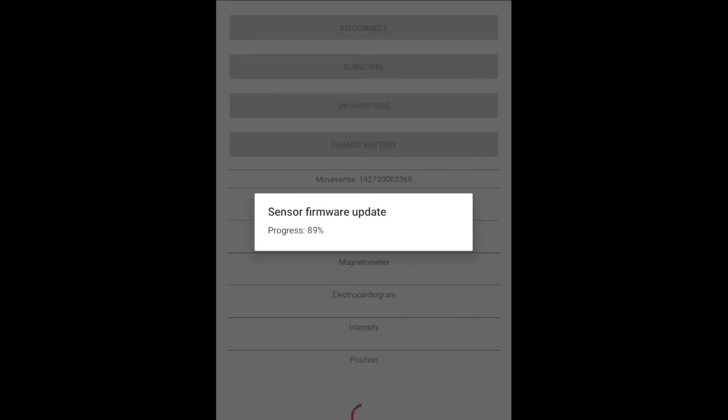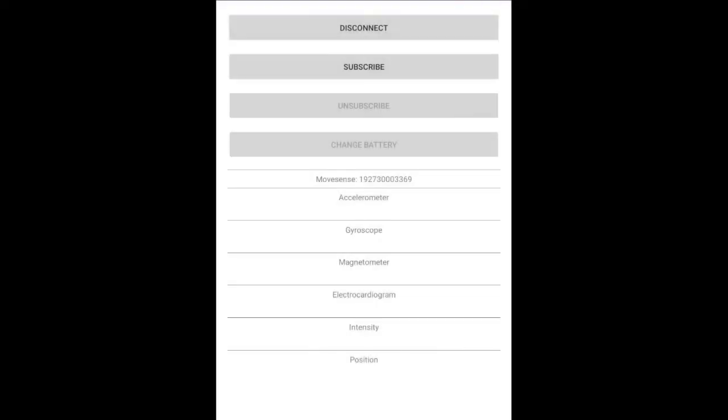So this way you can just take any of the sensors, and if the firmware is not right, the software takes care of it and does all the installation on its own, and you don't have to think about how things actually work. So now we have the update. Here you see that we're connecting to 369 and it's now compatible with the application, raw data coming in, pre-processed data coming in, and that's all about it.